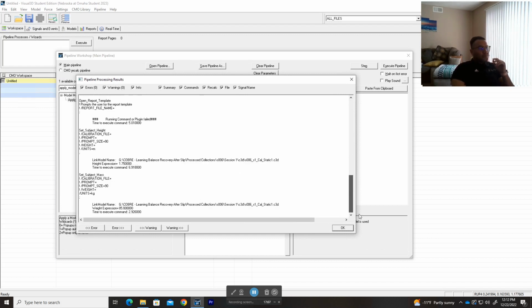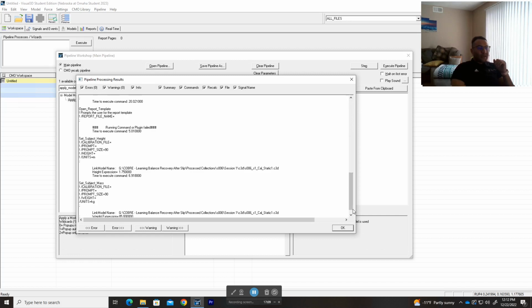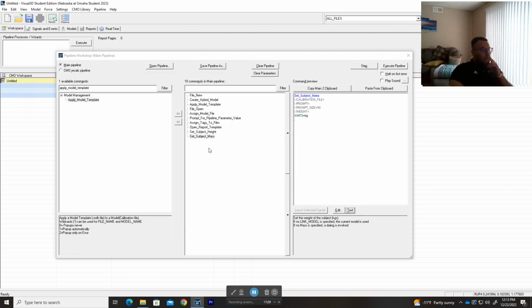Here you don't have any problems. Sometimes the pipeline works fine but gives you warnings. It means that there's no problem with the actual coding, but you might have some missing data, or some miscalculations and things like that. So always check the warnings as well as the errors to make sure that everything is running smoothly.